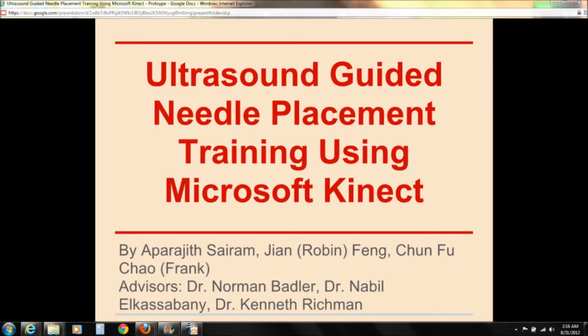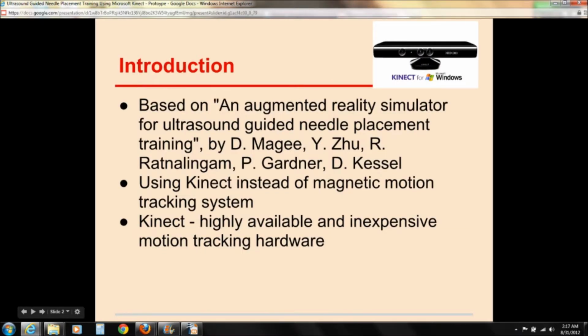We present a software for training new anesthesiologists using Microsoft Kinect in ultrasound guided needle placement. For developing the software, we refer to a paper written by Dr. D. Magee et al., called an augmented reality simulator for ultrasound guided needle placement training.